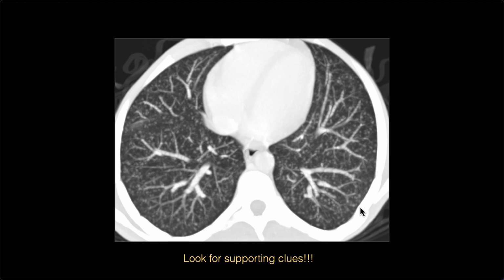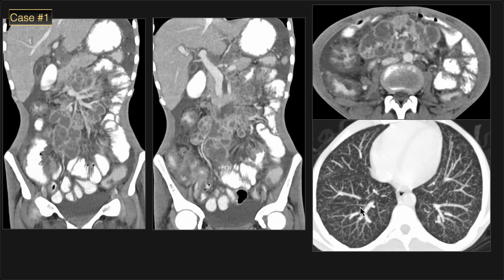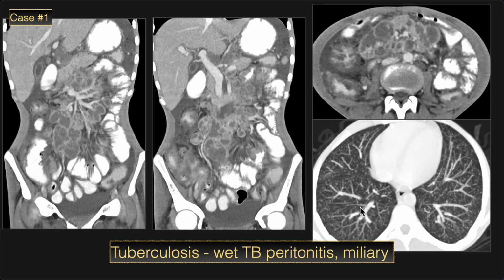And of course, sometimes abdominal imagers need to take a peek above the diaphragm, and in this case we find the helpful clue of miliary micronodules throughout the lungs, indicating hematogenous spread of infection. And so for our first case, we have tuberculosis, a combination of wet tuberculosis of the abdomen and pelvis with peritonitis, including ascites, bowel wall thickening, and cystic nodal disease, and also miliary disease of the lungs.